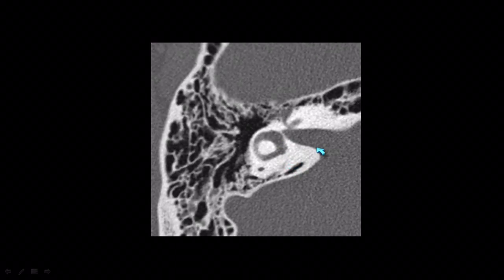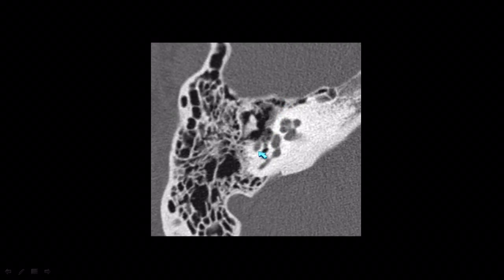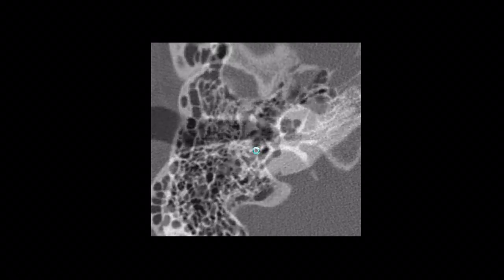So then on CT, we're going to see the intraosseous segments as we go through. So we have the little tiny labyrinthine segment going forward through the labyrinthine part of the ear. So it's just 4 or 5 millimeters going anteriorly. Then we have our anterior genu and the tympanic segment. So that's about 1.5 centimeters. That tympanic segment going back just under the lateral semicircular canal. Then we have our posterior genu, the posterior turn. And then we have our descending or mastoid segment where it looks like one mastoid air cell is opacified, extending down inferiorly, posterior to the external auditory canal.